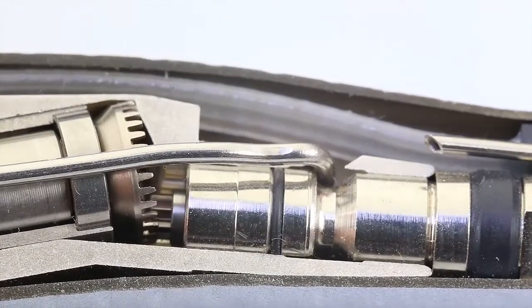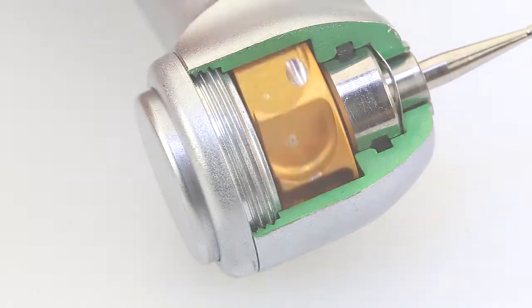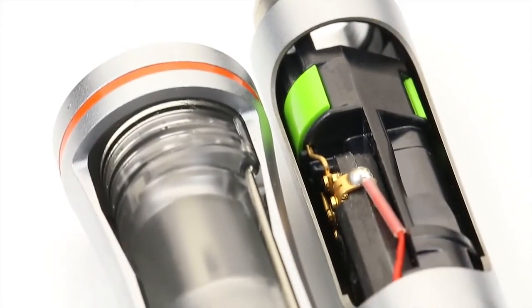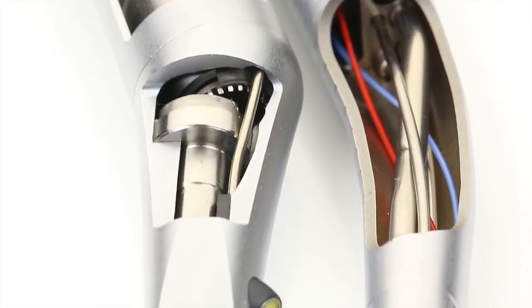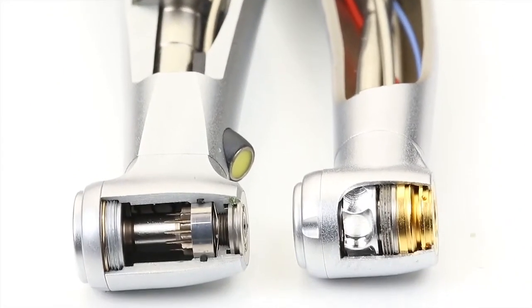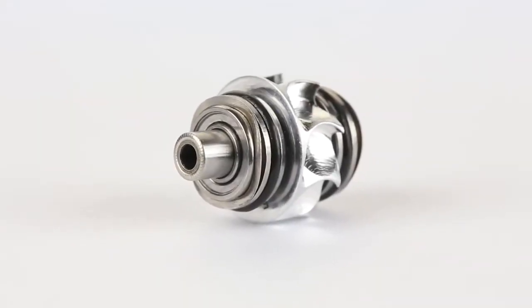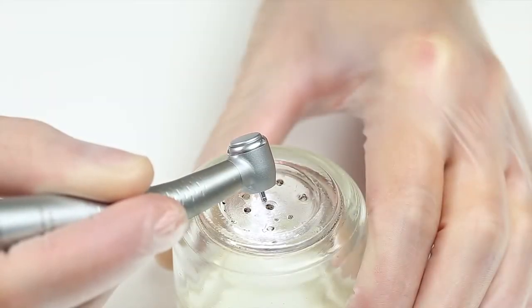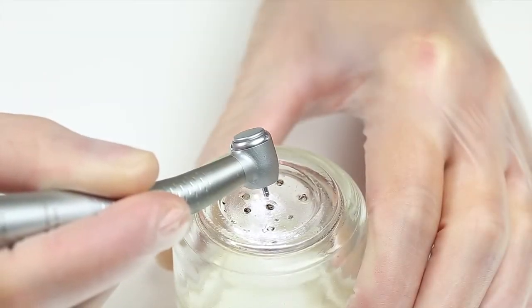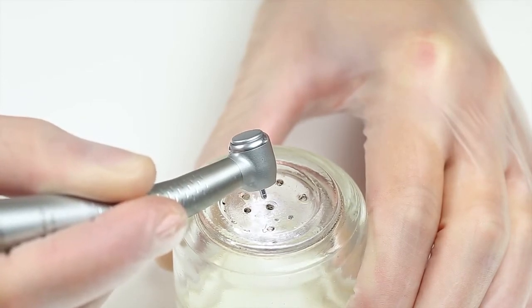In any case, in use there are certain differences which could have a major influence on the purchasing decision. Air-driven dental turbines are more lightweight than red contra-angle handpieces, need no additional motor or control, and require less investment. As these turbine handpieces are only driven by a small rotor, their power is limited and seriously dependent on the contact pressure. Setting the speed is generally not possible, and the high-frequency operating noise is unpleasant for many users and patients.